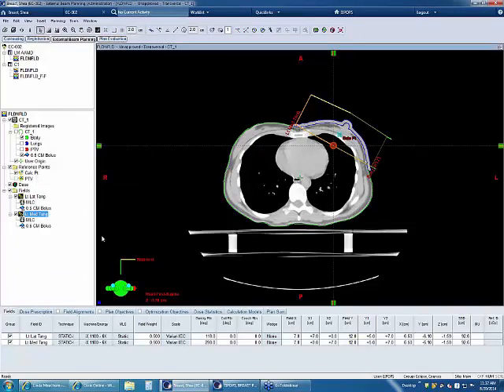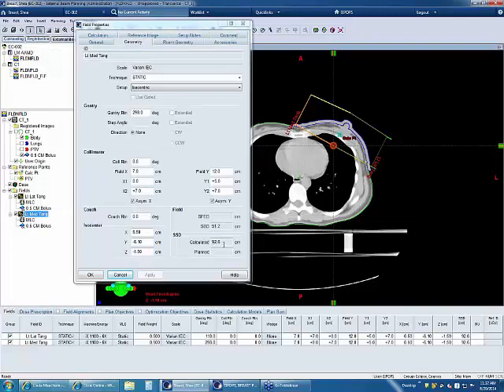It's a 1/2 cm bolus. And when I go to my Properties on my tangent field, you see my calculated is 92.6, right down here. But it's not exactly a 1/2 cm. It's more like, I would say, almost a cm, because it's coming at this angle.